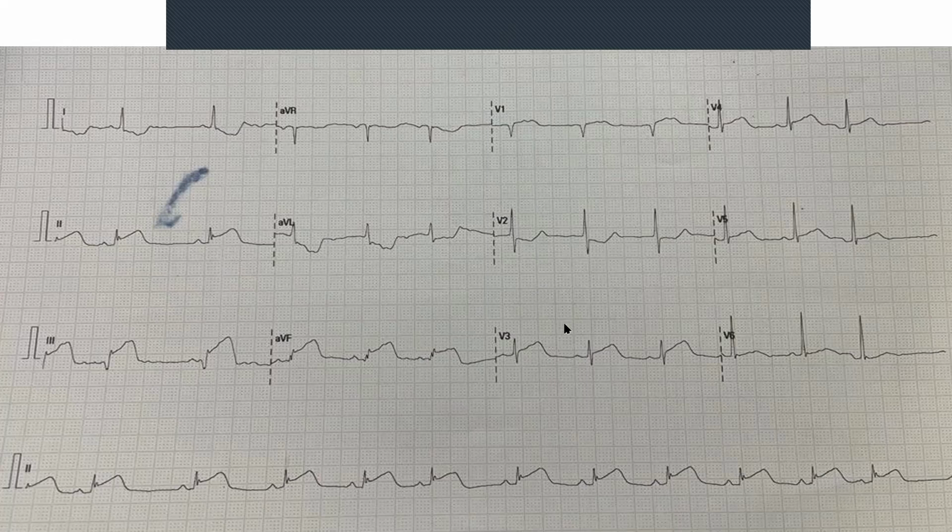V3 and V4 are your anterior leads. So remember V1 and V2 here, V3, V4. They're looking at the anterior part of the heart. Is there anything that you notice? I know it's very tempting to say this is an ST elevation. It's actually not an ST elevation. It's something we call a high takeoff. In other words, it starts and just goes up a little bit. And in V3 especially, it depends on age and sex. It can be a normal variant that you get a slight ST elevation. But that we're not going to stress about.